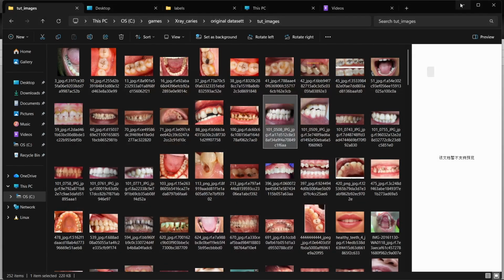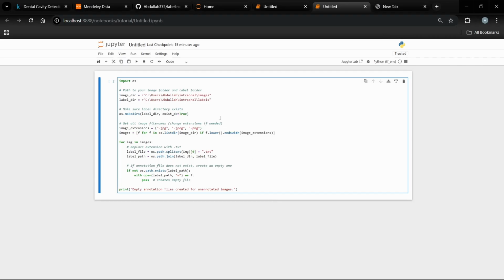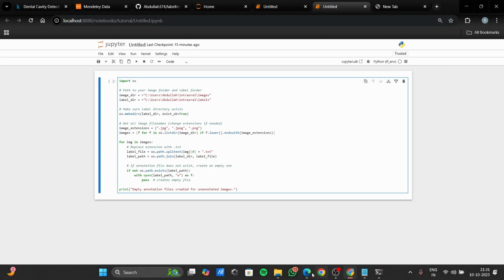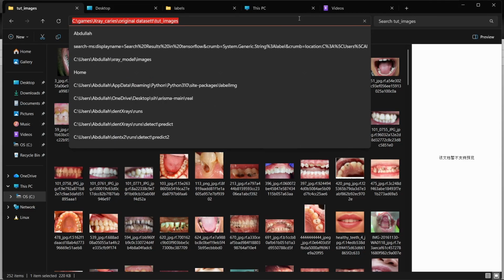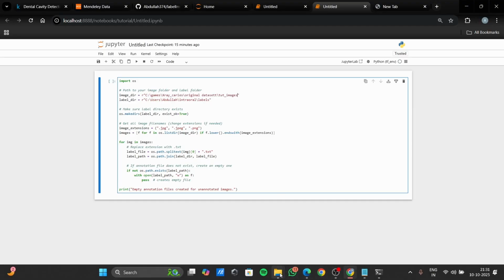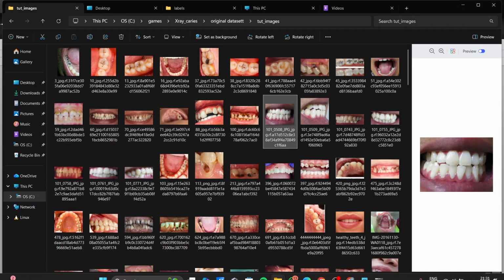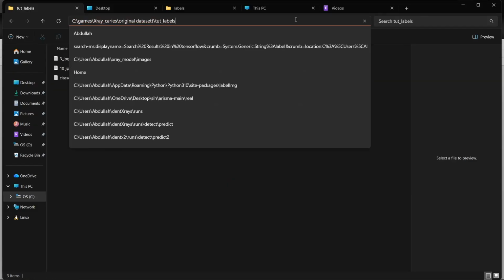So let's see, over here we have this. Instead of this, we're gonna copy this and keep it here, and wherever our labels folder is, we're gonna just copy that.